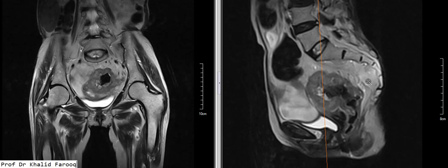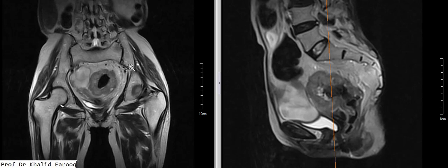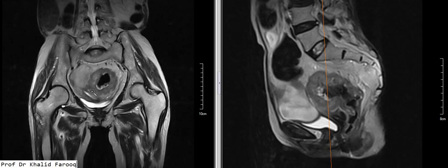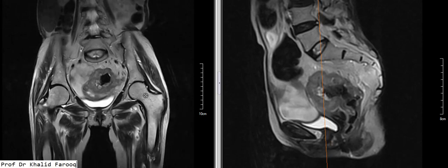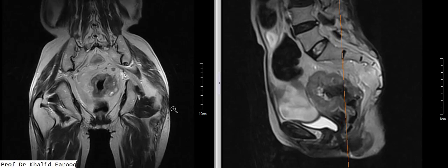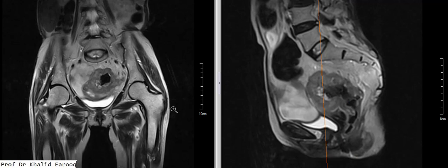Similarly, in this presacral space, major portion of this area is clear, and bony boundaries are unremarkable. SI joints and hip joints are normal. So disease doesn't extend up to pelvic bony boundaries. Pelvic muscles are spared as well, and there is no free fluid or ascites. There is no pathological pelvic lymphadenopathy. So these things need to be addressed.